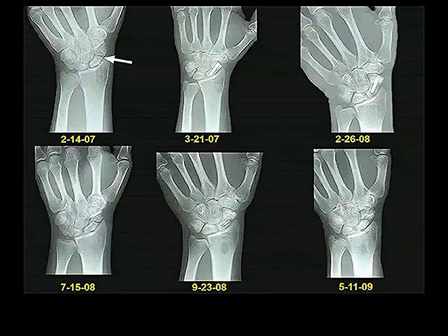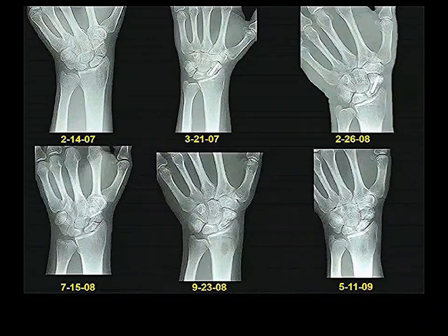This is a particularly bad fracture to have because the blood supply, all bones need blood supply or they die. The blood supply to the scaphoid enters its distal part and then travels proximally to feed the more proximal part of the bone. So when you fracture your scaphoid right through the middle, you risk cutting off the blood supply to the proximal fragment, and it will die eventually if it doesn't get blood.